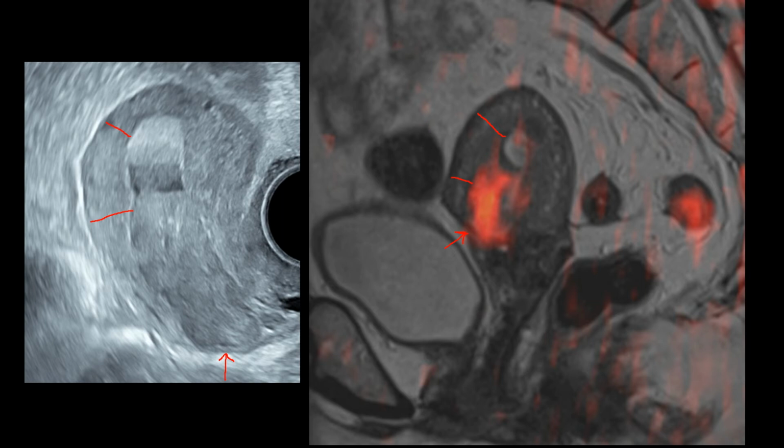and that's the reason why the uterine wall is thin at this part, and it is typical of the lower uterine segment caesarean section scar. The configuration of the uterine contour here is more in favor of a scar, and is also very well seen here on the transvaginal ultrasonography.